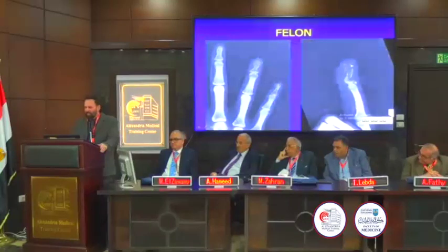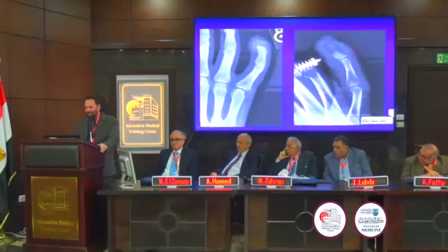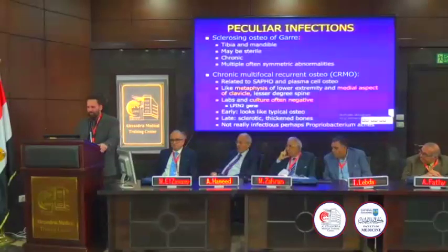And here's another felon, always in the tips of the fingers. Yet another one. And a sequestrum, a cloaca, and an involucrum on CT.